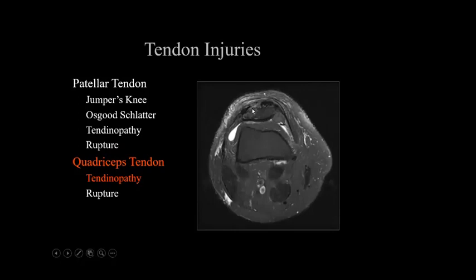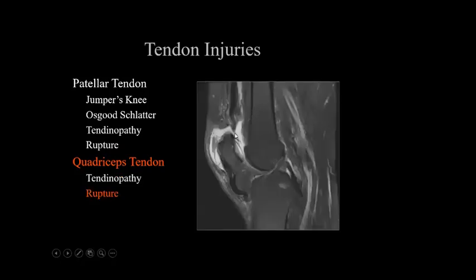Move on to the quadriceps tendinosis. Again, we see another patient with a quadriceps tendon injury and complete tear. And what we see here is patella baja, when the patella itself is low in position, and that's because of the tendon rupture. Sometimes if you do a knee x-ray and you see patella baja, always suspect quadriceps tendon rupture, especially if there is history of acute knee injury and loss of extensor mechanism. So we should always be suspicious of quadriceps tendon rupture.